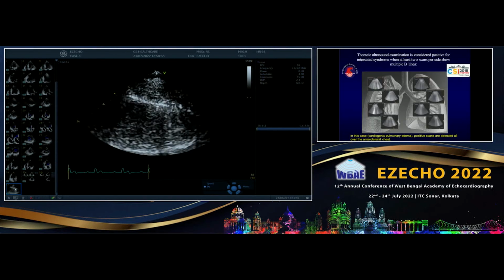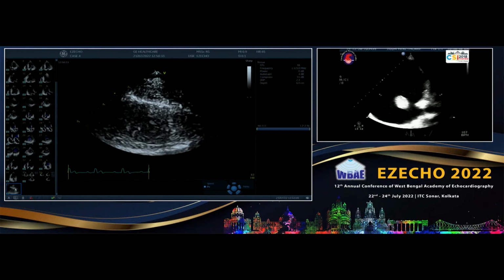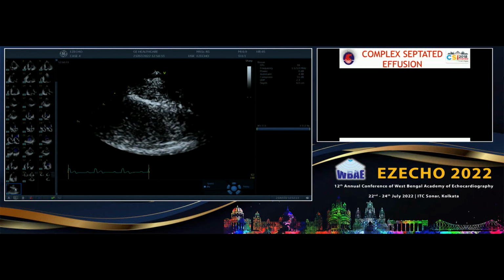But you get something like this. You know, these ones. Very broad, bright comets, these broad comets. They're very classical. Actually, you start doing it for all your LVF patients, and then you will know it, okay? And then pleural effusions, everything you can see anyway, that is a different issue.